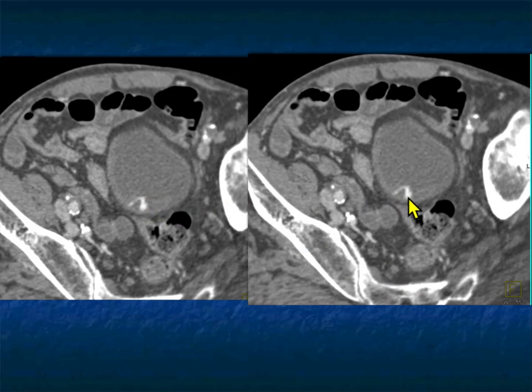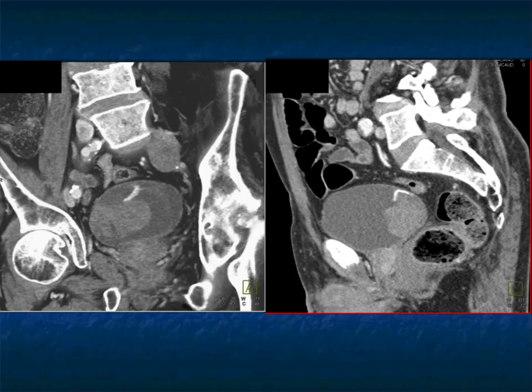That's a jet. It could be from an ulceration. It could be from trauma. I've seen it where the patients have had a Foley catheter placed, for example. I've seen it from biopsy. But look at that jet of active contrast material, and there's also hemorrhage. So a really nice example.